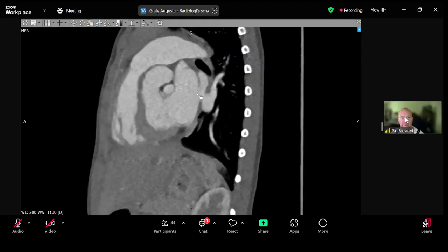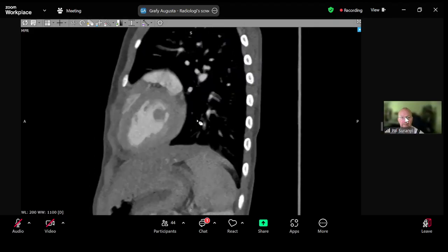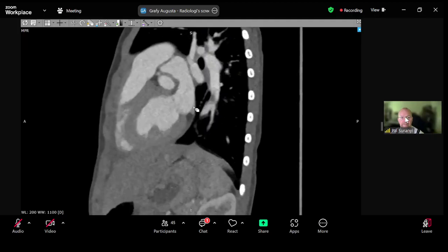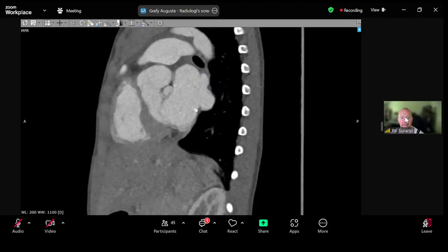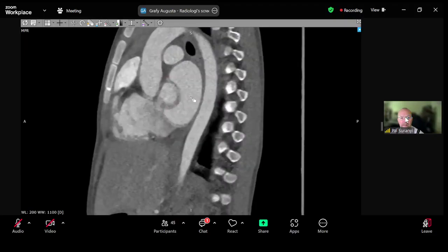Let's follow the left atrium. So there's our left atrial appendage, so we can follow that back. And then we were concerned more with the right-sided veins, right? So there come the left-sided veins. They're fine. Keep going.